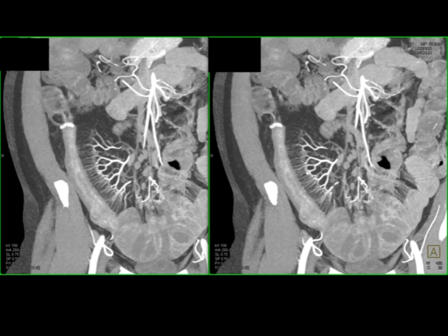You can see on these MIP images very nicely also the thickening of the small bowel, the abnormal enhancement. The patient has had prior surgery in this region, but just a beautiful example. Also, mesenteric nodes are present. Fibrofatty proliferation is seen here, but that's not the sign I'm thinking of. Fibrofatty proliferation is common in Crohn's disease and can simulate a mass on plain films or on fluoroscopy.